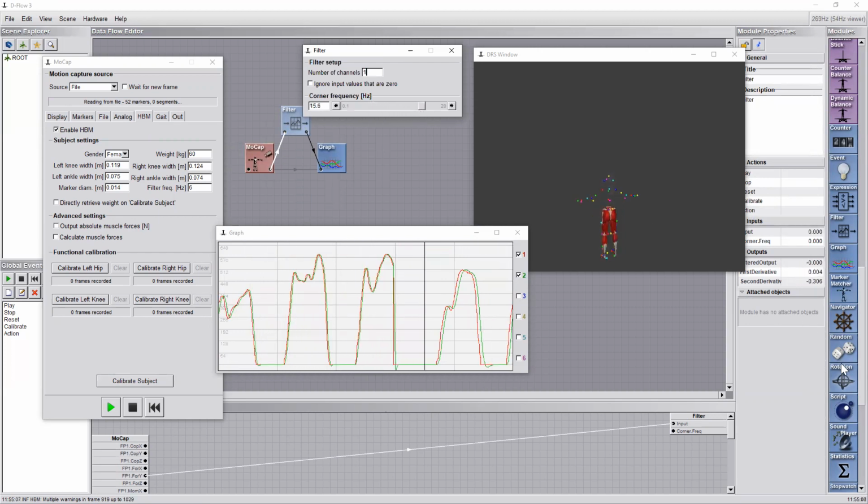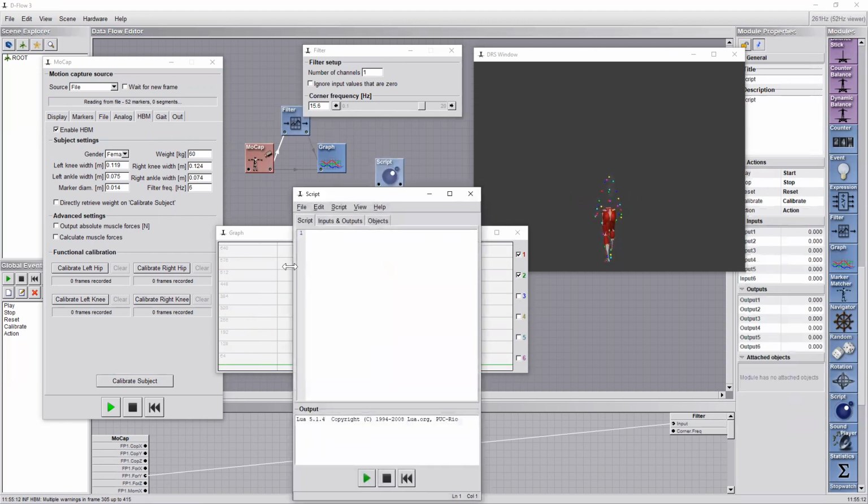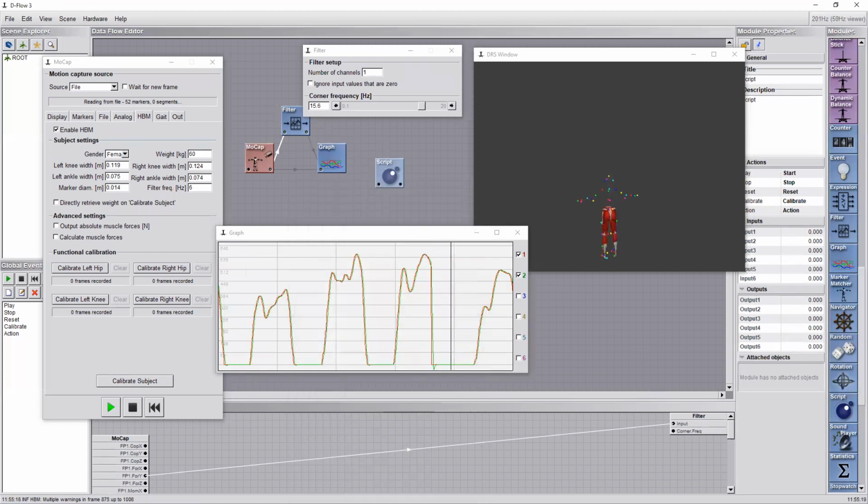So as I said, the quiz was how you can do it yourself. Like you have your own idea, your own filtration. So how can you code it here? Let us know. Would be glad to hear from you.